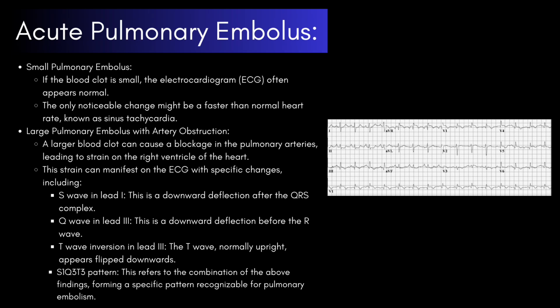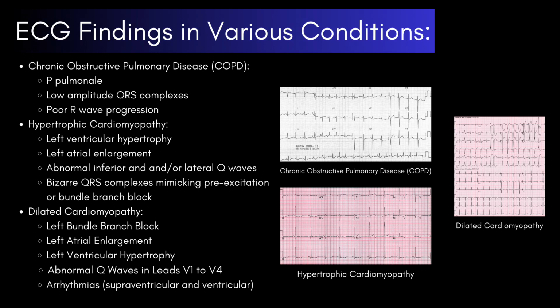T wave inversion in lead 3. The T wave, normally upright, appears flipped downwards. S1, Q3, T3 pattern. This refers to the combination of the above findings, forming a specific pattern recognizable for pulmonary embolism. Let's look at ECG findings in various conditions.